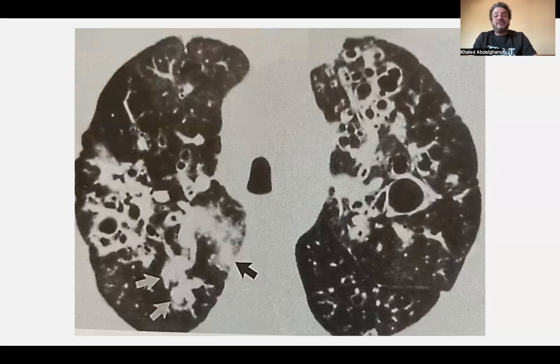Here, the last image provided in the post, we see that cystic bronchiectasis is one of the pitfalls. It's not a true cavitating lung disease, but it's a pitfall because of its appearance. The other types of bronchiectasis are well differentiated and can be diagnosed easily, the cylindrical type and the varicose type, as you can follow the continuity and branching pattern of the bronchiectasis.